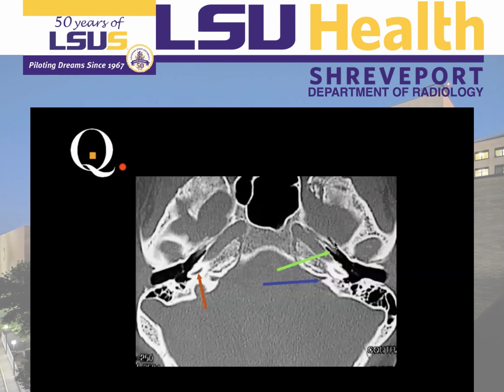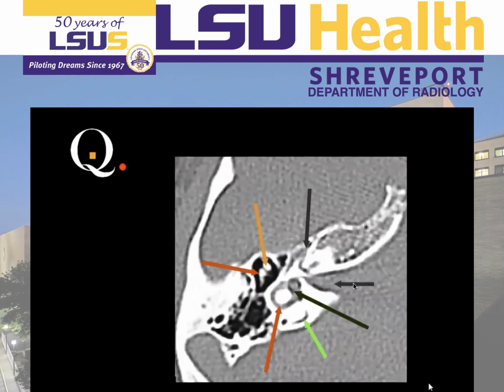And this is a bony spike, and this is where the tensor tympani muscle arises. Then you always have to look for the pyramidal eminence, the sinus tympani, and the facial recess. Okay, head of the malleus, body of the incus, short process of the incus, lateral semicircular canal, vestibule, portion of the posterior semicircular canal, internal auditory canal, facial nerve, ascending part, geniculate ganglion, descending portion of the facial nerve.